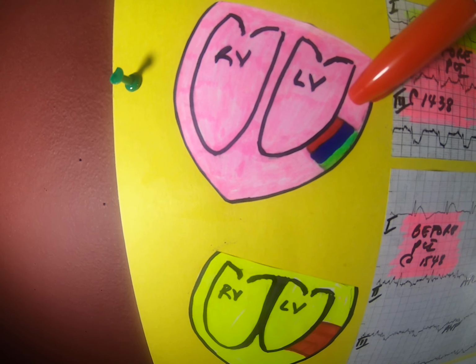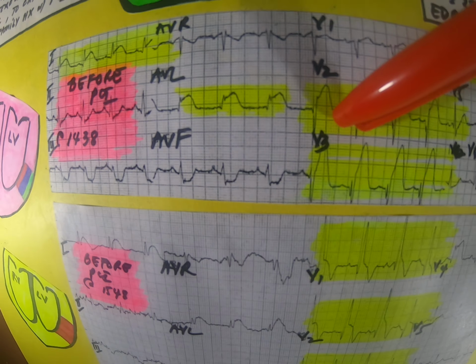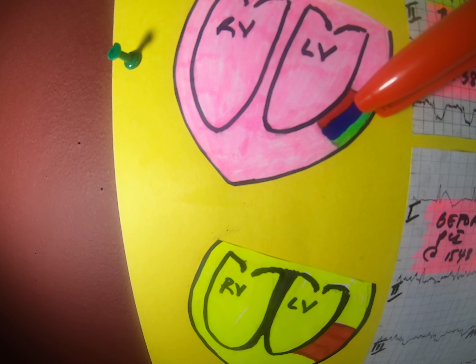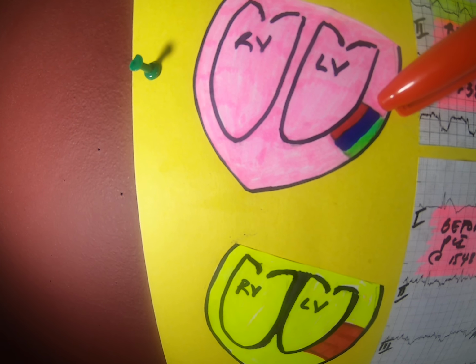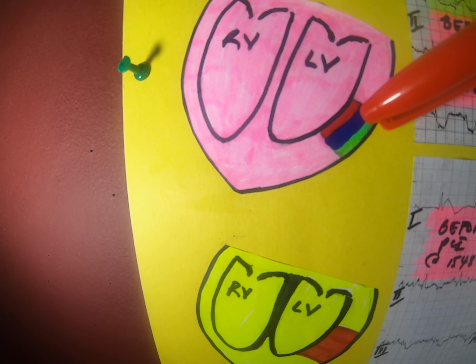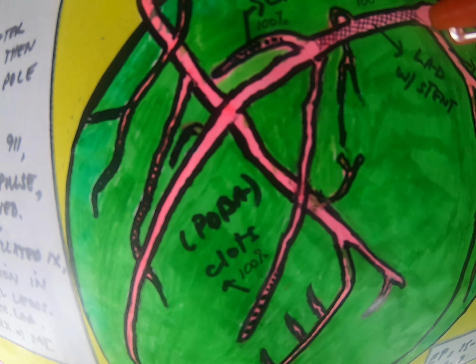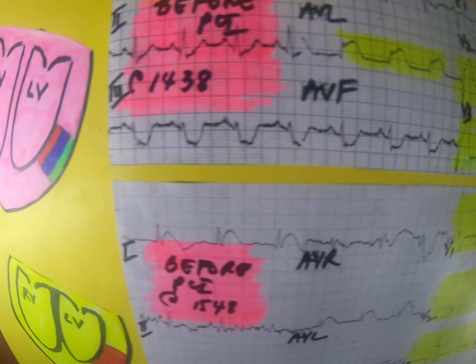Okay, now if you delay, so if you see this part is being dead, sometimes you see Q waves. Okay, if you delay, then this infarction will progress deeper. So it will hit this part in here, and this part is vulnerable. So 50-50, either it will die or it will live. It lies in your hands. Okay, you see this ST elevation, they are actually potentially will die if nothing has been done. They are injury. Okay, so we have to save this portion, and that's the reason why we have to bring them to the cath lab, and whatever blocked artery, they're going to open up the blocked artery.